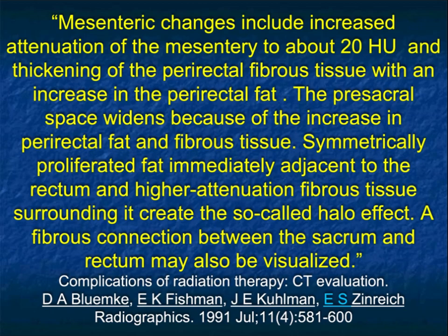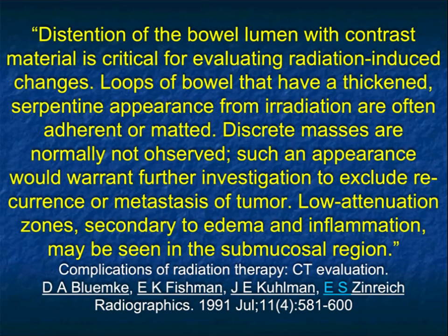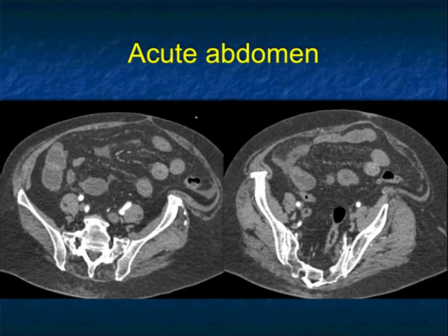So this paper is 30 some odd years old, but it was pretty accurate then. It was one of Dave's great radiographic articles. In the same article, distension of the bowel lumen with contrast material is critical for evaluation of radiation-induced changes. This does make the point, like we say today, positive contrast is often very valuable in making the correct diagnosis.